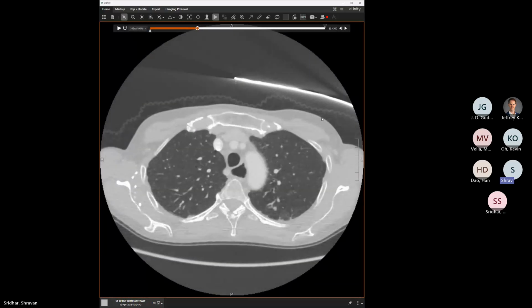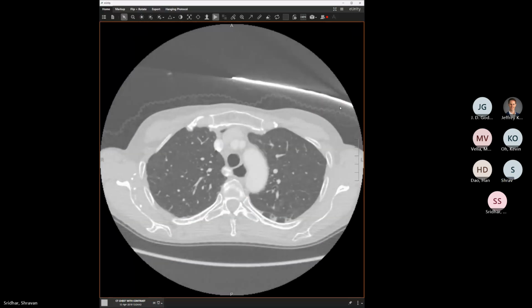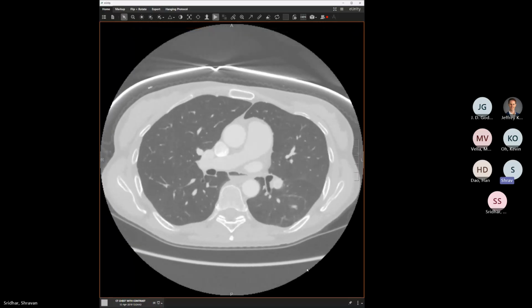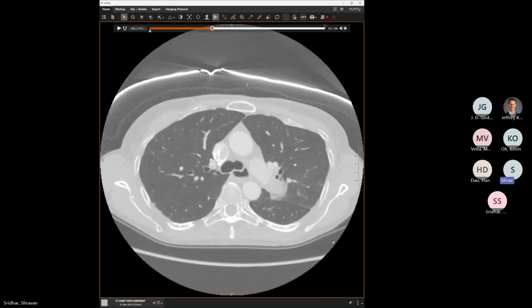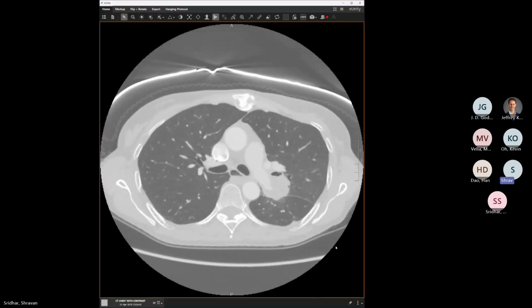If you look at the lungs, there's a little bit of ground glass, and we have a couple of nodules here and there. So anyway, this patient maybe presented at an outside hospital, how these usually go. I assume it was thought to be some sort of PE, maybe treated, and the clot wouldn't go away. And so they transfer them here. And then at that point, we considered the possibility of a pulmonary artery intimal sarcoma. And that's what this ended up being.